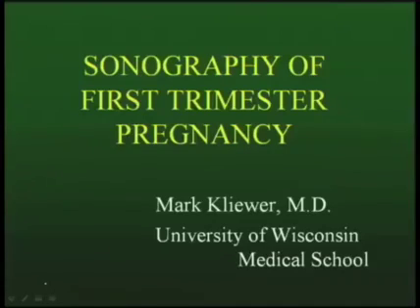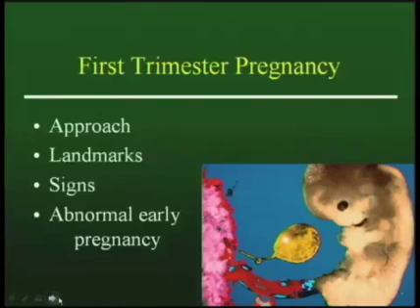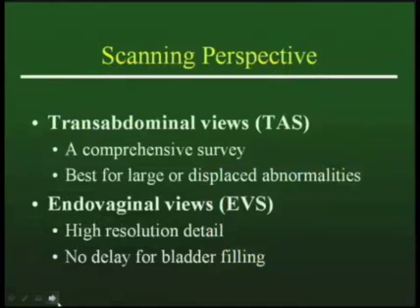Well, I'll take up the topic of sonography of first trimester pregnancy in four different subtopics: approach, landmarks, signs, and abnormal early trimester pregnancy. First, with regard to the approach to diagnosis, as many of you who do ultrasound know, there are two ways of looking at the female pelvis, both the transabdominal views and the endovaginal views.